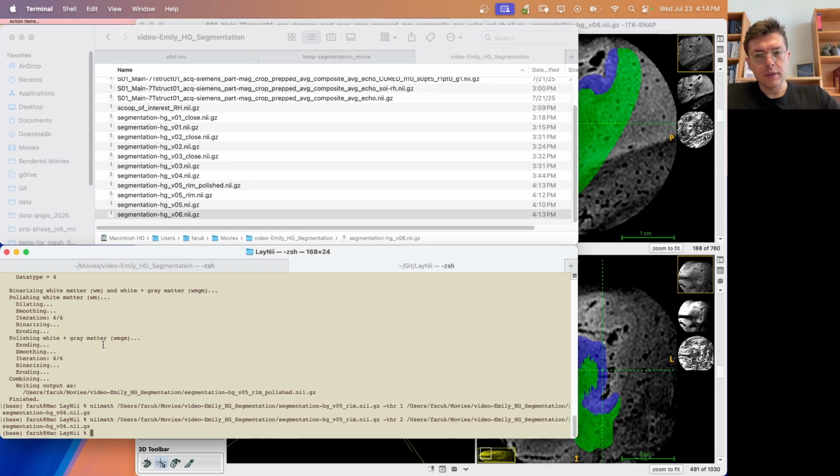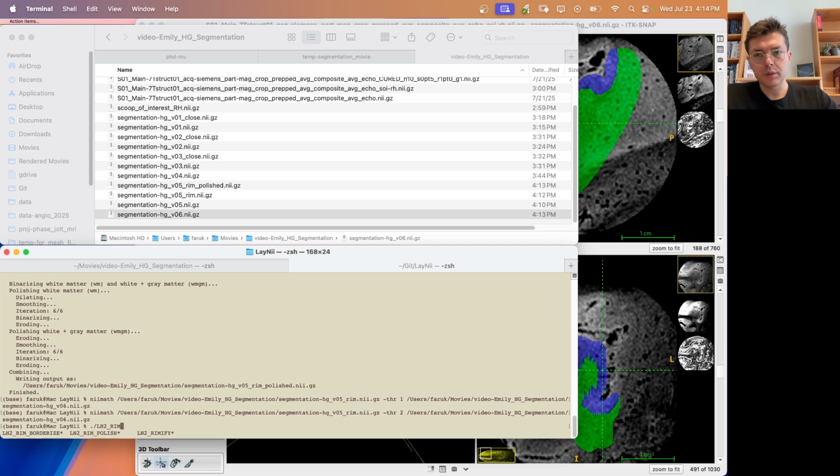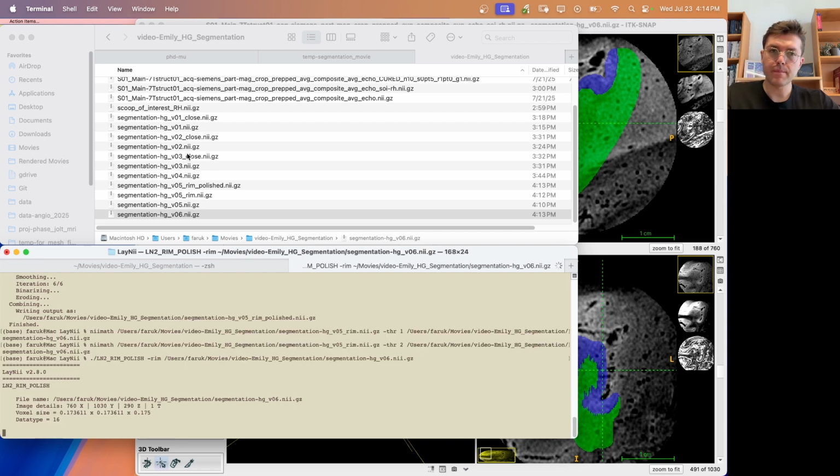Okay, now let's run ln2 rim polish with actually this one.